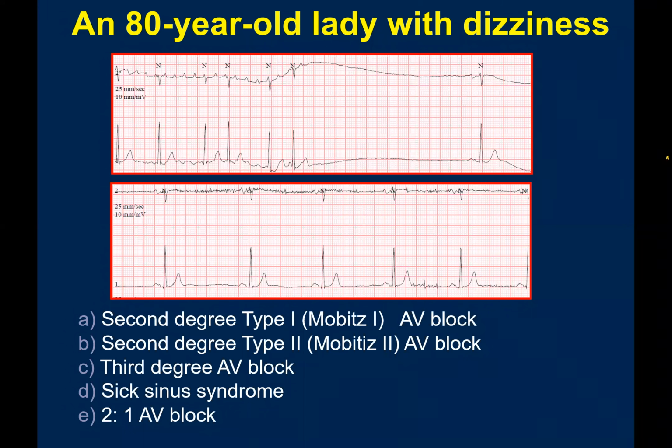Looks like sinus pause. So we have an irregular rhythm, and then an irregular rhythm, right? And then we have this pause, as you mentioned, sinus pause. And then after that, what is this rhythm strip here? And then back to sinus. And sinus brady, actually, if you count 1, 2, 3, 4, 5, 6, 7, yeah, less than 50 for sure.